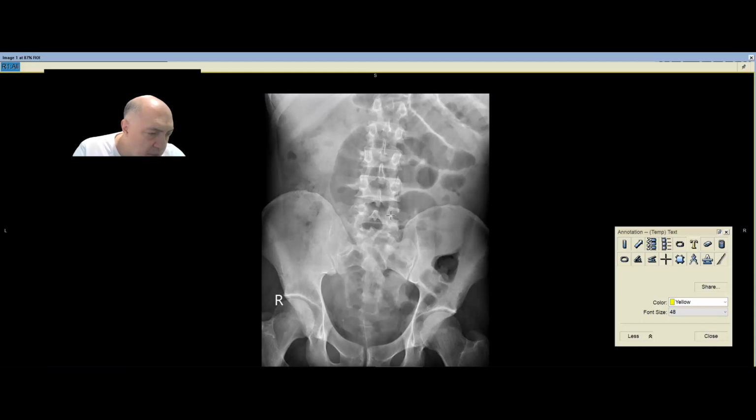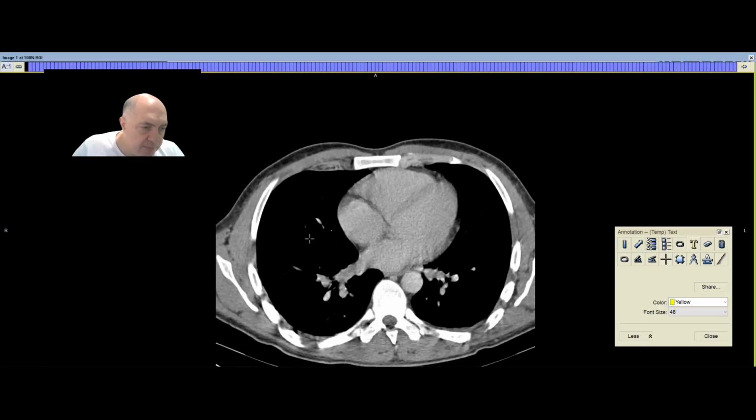Some tumors can block the small bowel, maybe a mass even in the cecum can block small bowel. So we'll have a look and see what the CT shows. That should give us an idea of what's causing the obstruction. So let's bring the CT in there.